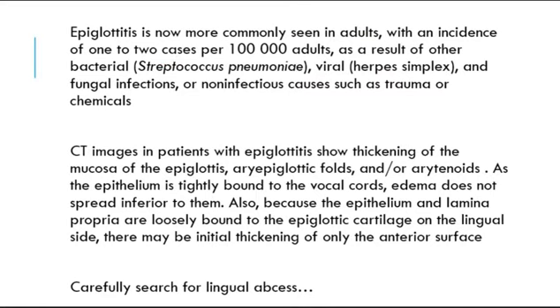Epiglottitis was previously known to be in children, but nowadays it's more commonly seen in adults, with an incidence of 1 to 2 cases per 100,000 adults. It's caused by Streptococcus pneumoniae, or viral infection or fungal infection, or due to trauma or chemicals. In the CT imaging of epiglottitis, there is thickening of the epiglottic mucosal folds and aryepiglottic folds and/or arytenoids, and the other things we mentioned.